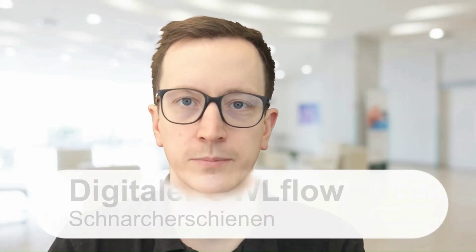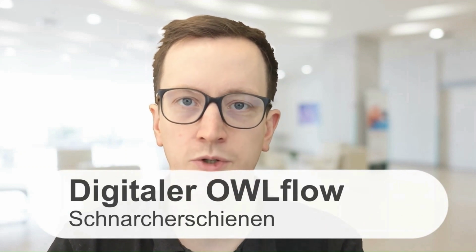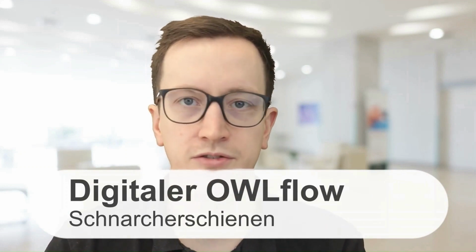In this video, I will demonstrate the complete workflow of a snoring splint, starting from placing an order on the website, through the entire work processing in Owllab, all the way up to the invoice, and also encompassing the design aspect of the project. So let's simply begin on the website.